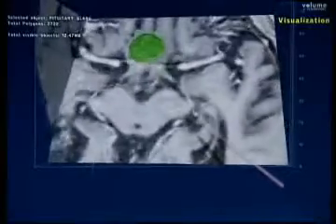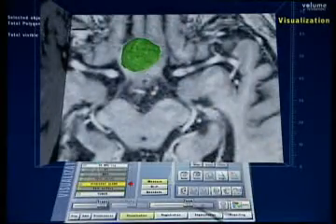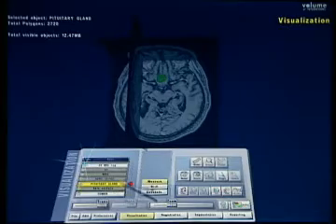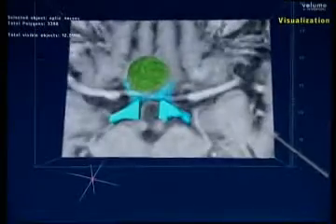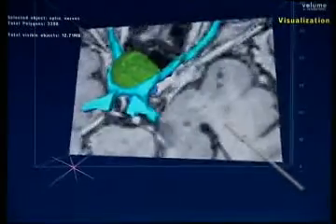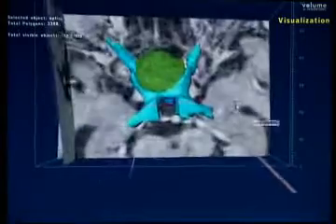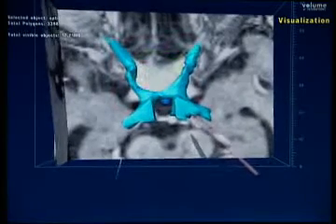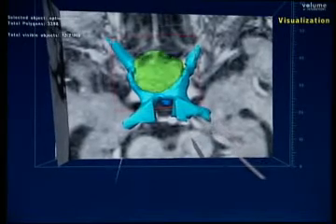Okay, that's one thing. Now, what else is interesting for us surgeons? A lot more, of course. The next thing is the chiasm and the optic nerves, which we have segmented. You can see them on the MRI. So we employed a manual segmentation method. It takes you about 15 minutes. They don't look super nice in terms of their outer appearance, but they are accurately placed. And then you can see already that the lesion is pushing the left optic nerve much more than the right, which was also reflected in the clinical symptoms of the patient.